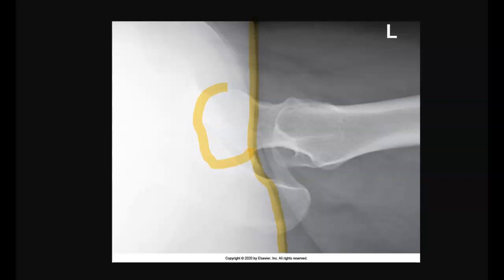I know a lot of us were thinking that there was an excessive angulation problem here. However, if anything, there might be a slight rotation problem. However, the main point of this projection was for you to identify that the unaffected leg is actually obscuring the acetabulum.